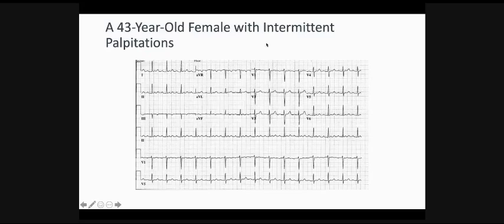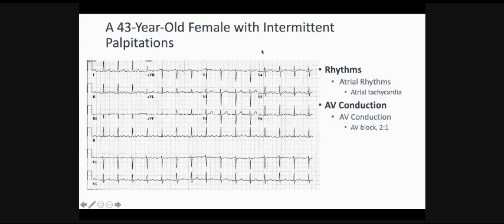Right. So I got some correct answers and some not, but it's always an arrhythmia. I think Dr. Najmuddin and Ben Rawandi will touch on the arrhythmia part in their ECG coding. Now, we're going to code this as an atrial tachycardia and AV block with a 2-to-1.